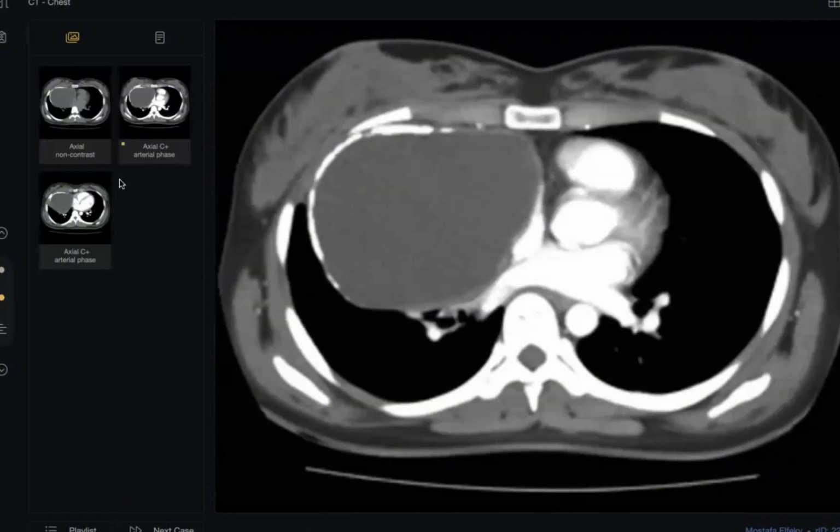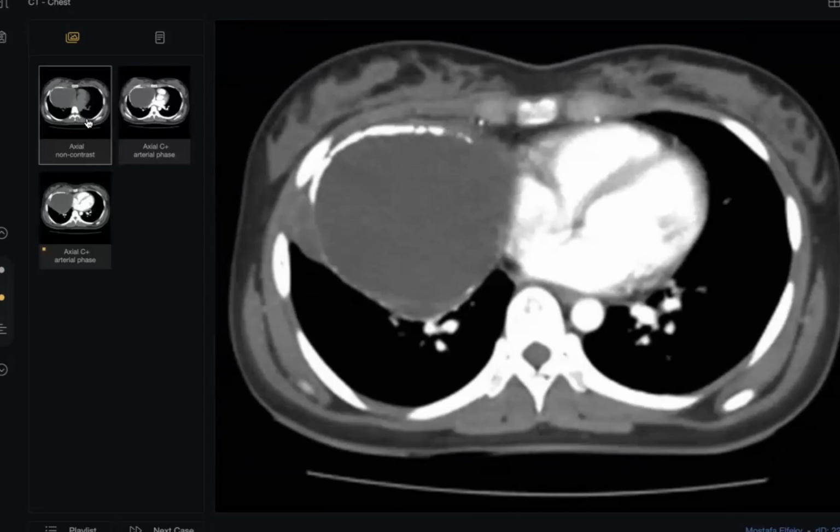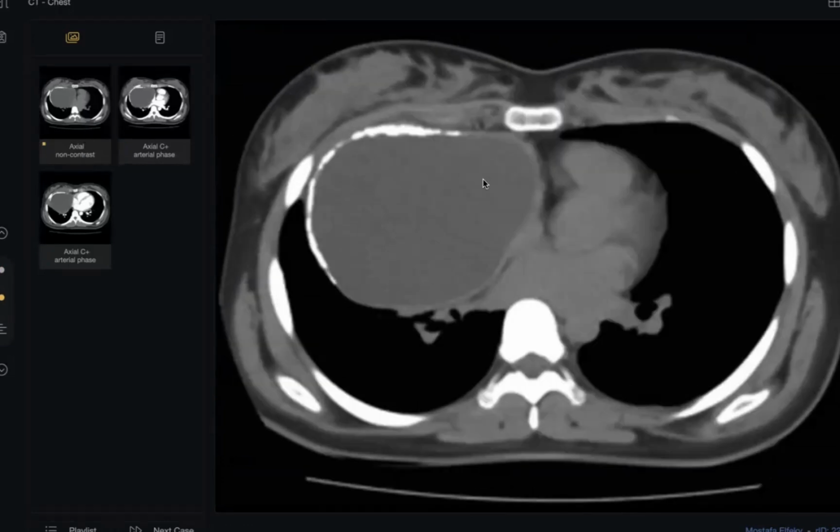This is a CT. So this is an axial contrast-enhanced CT scan of the chest. What's your diagnosis? I believe this is a pericardiac cyst because it's hypodense and there's peripheral calcification. It could be a pericardial cyst, correct. But what else? Bronchogenic cyst. Okay, what other cyst? It's very common to have a large cyst with peripheral calcification.